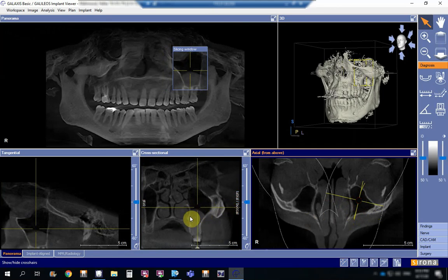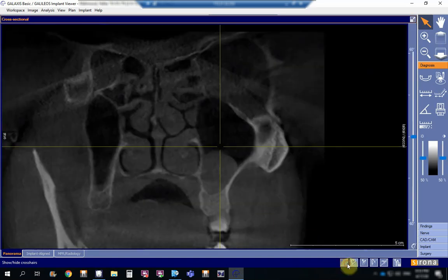radiolucency, which is a dome-shaped radiolucency. Actually, it cannot be fluid, because fluid does not assume this shape, but takes a more flat shape, because it doesn't go this way. So this is more of a polyp or an allergic reaction. A polyp is most likely. Anyways, this is not our issue. We'll talk about this when we discuss the diseases of the maxillary sinus.